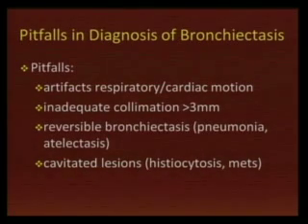Regarding the pitfalls of bronchiectasis, we have many situations. For instance, artifact from respiratory or cardiac motion, inadequate collimation, reversible bronchiectasis that is seen in cases of pneumonia, or something else that is mimicking a dilated bronchus or dilated bronchi, like cystic lung lesions.